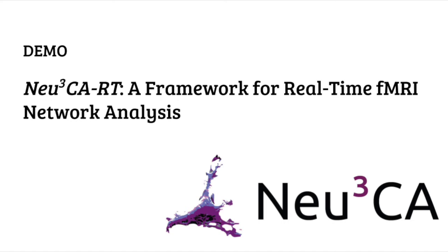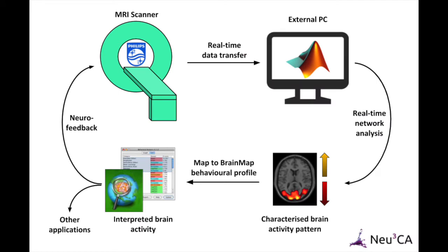So this is a demo for Neu3CA-RT, a framework for real-time fMRI network analysis and neurofeedback. We have developed this toolbox here at our research group Neu3CA at the Eindhoven University of Technology. The basis for this toolbox is to provide neurofeedback to a subject inside an MRI scanner.